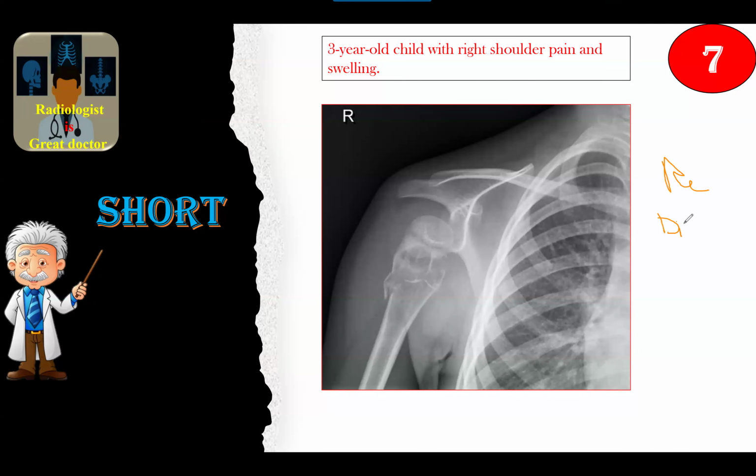So it's likely aneurysmal bone cyst or simple bone cyst with fracture, and I would refer the patient to an orthopedic surgeon for further management, and MRI if clinically needed. Very good. As you said, it's a benign lesion. It's a fairly well-defined lesion in the proximal metaphysis of the humerus, lucent center, fallen fragment sign with fracture of the cortex, no periosteal reaction, no aggressive criteria. It's a simple bone cyst with pathological fracture.